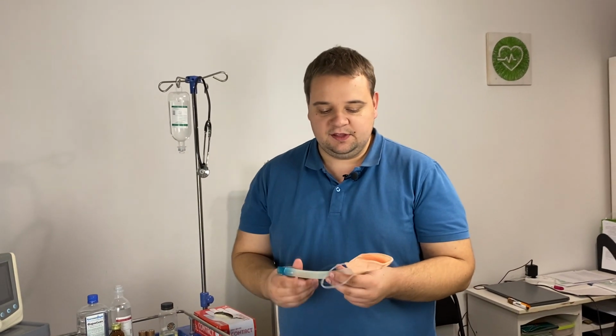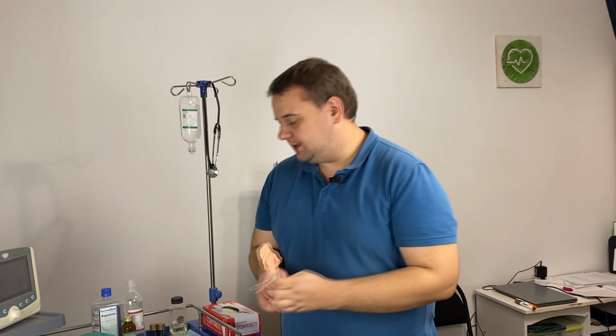Generally, we have the intensive care specialists, and we have special rescue ambulances and so on, which are highly trained in acute care, and they're responsible for the intubation. And if it's not available, then we use some supplementary devices. They say that the closest alternative to the intubation is the position of the laryngeal mask. So if you're not a specially trained medic for the intubation itself, then this is your top choice. This can provide prolonged and right ventilation of the patient until a special team arrives and they decide if they want to replace it.